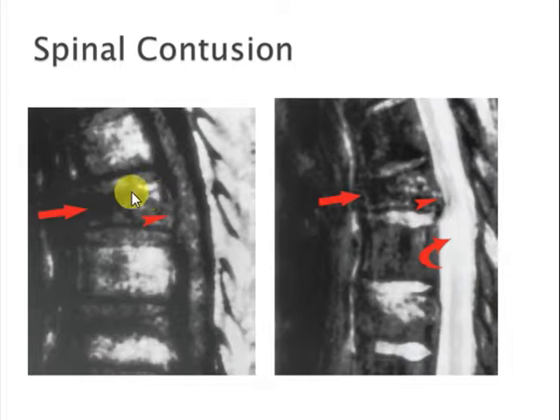indicating a recent event, and there is some bulging posteriorly into the spinal canal with increased T2 signal intensity of the spinal cord indicating cord edema. Here we should be careful that if there is any evidence of bleeding or hemorrhage or hematoma within the cord, this indicates a bad prognosis. So we should be careful to look for these signs and to report them.